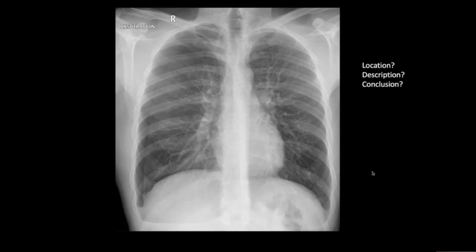On this chest radiograph, there is a lucent area with no lung markings in the right peripheral and apical regions. Note is made of a pleural line representing the visceral pleura. There is mild mediastinal shift to the left. This is consistent with a right pneumothorax.